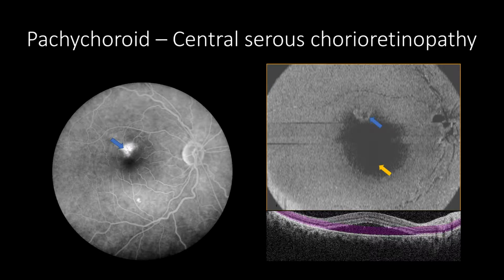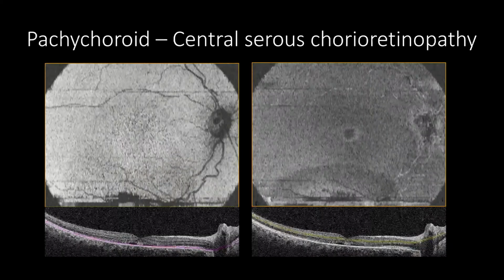Thus, Enface can be useful to follow up and to assess the disease's natural course or post-treatment efficacy, as shown in this slab post-treatment with subthreshold laser of the same case presented earlier, presenting resolution of pigment epithelial detachment in the RPE slab, along with absorption of most of the subretinal fluids.